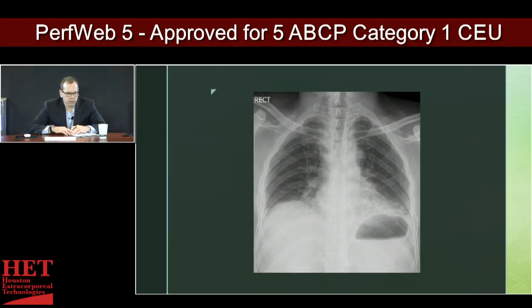So when you look at an x-ray, you really have to be concerned about what am I looking at? And I go through the same process every time I look at an x-ray. There are certain things that I go through, there's a certain order that I go through them in, and they each have their own reason.